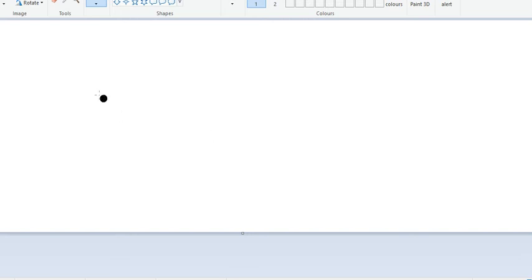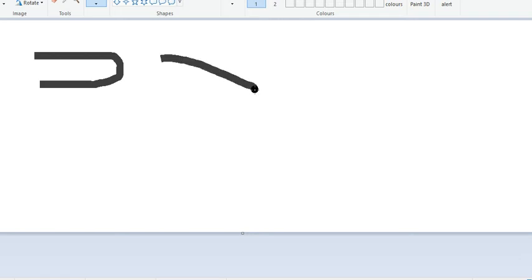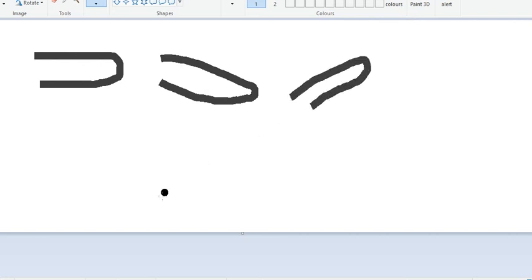And also looking in a horizontal view, this is a good position of a finger pointing directly forward, but we do see sometimes positional errors where the finger is pointing down or up, and these can cause errors. Positional errors can cause problems for interpreting the image.